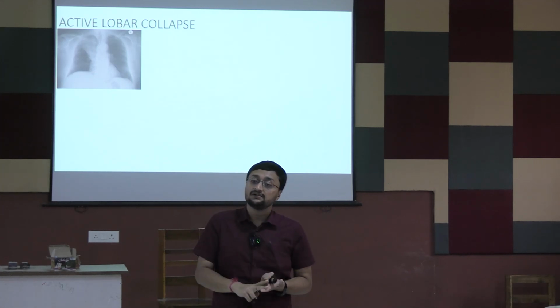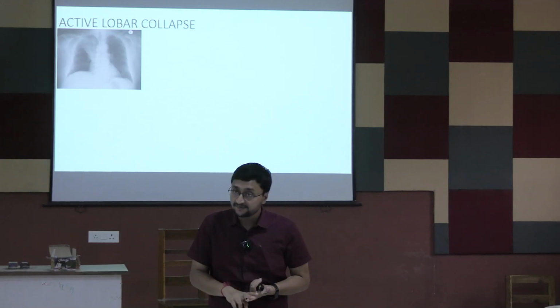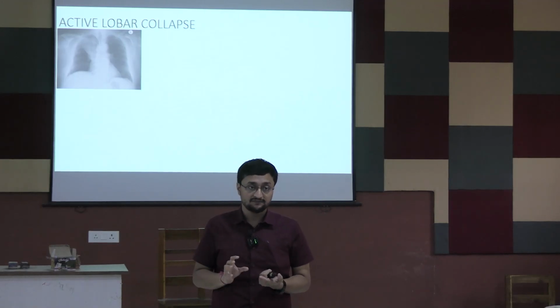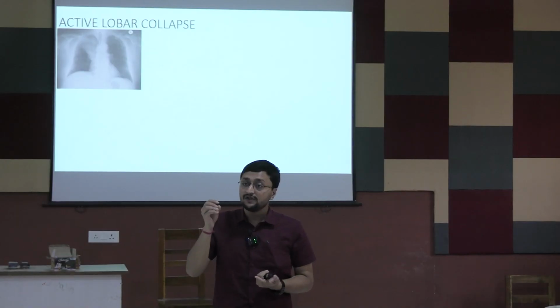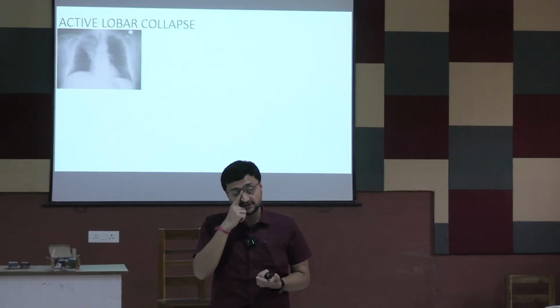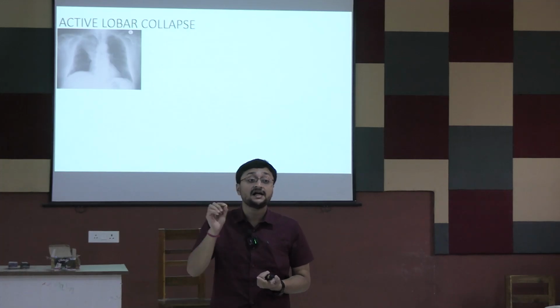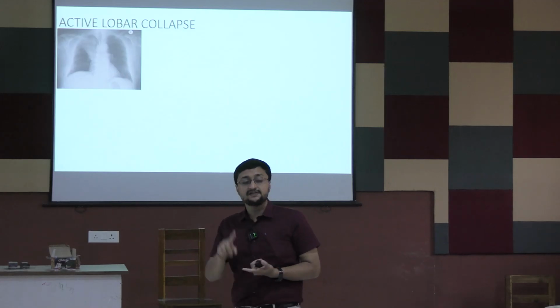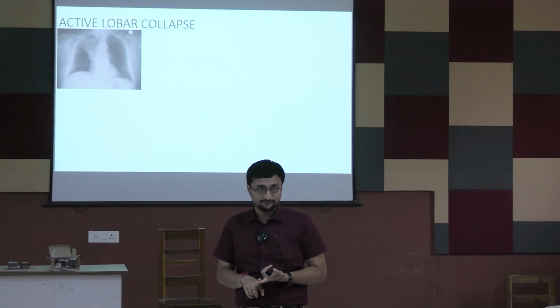But in case of collapse, the shadow is devoid of any bronchovascular marking. This bronchovascular marking in consolidation is called air bronchogram. In collapse, no bronchovascular marking is present.